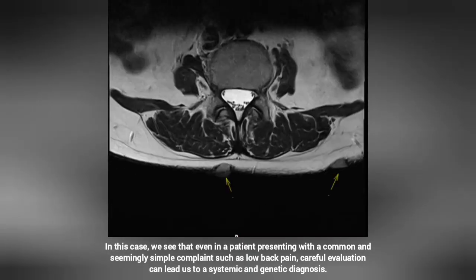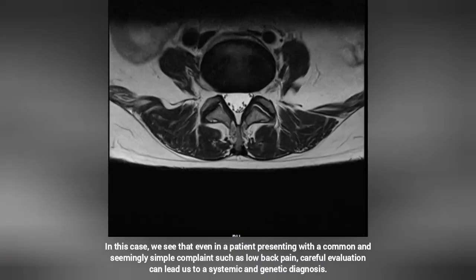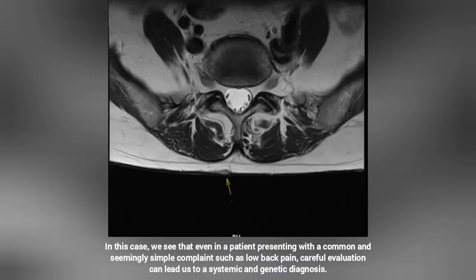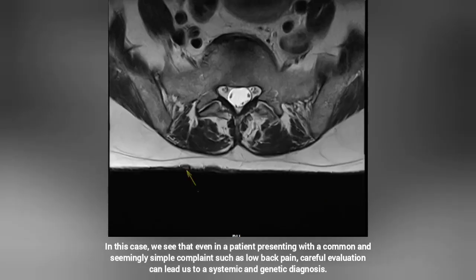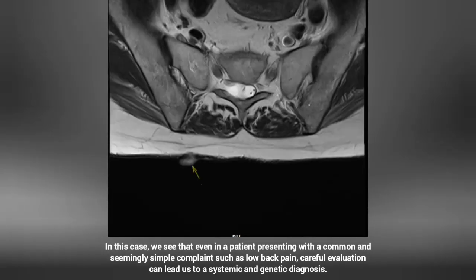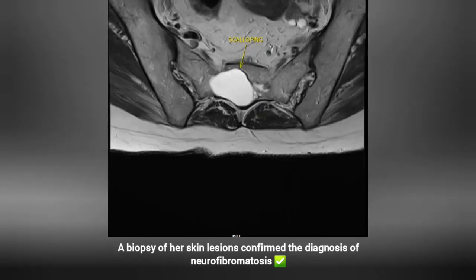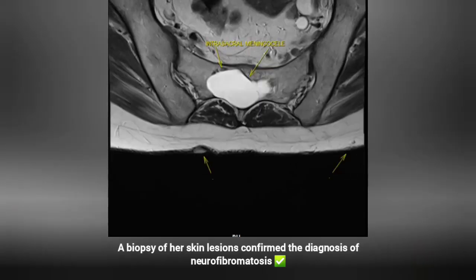Here, 2 important clues: a large intrasacral CSF containing sacculation with posterior scalloping, and multiple cutaneous nodular lesions. This combination should make us think of neurocutaneous syndromes. In particular, Neurofibromatosis Type 1. In NF1, spinal involvement can be quite common.